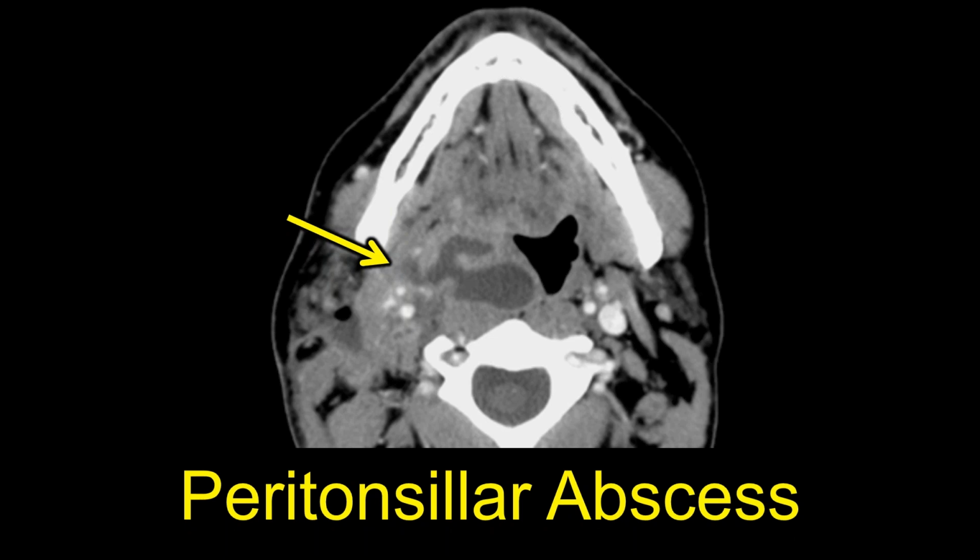or in clinical exam. So this is an axial post-contrasted CT. We see a fluid collection that's centered in that palatine tonsil, and we see surrounding inflammatory infectious changes, and we see the fluid has leaked out of the tonsil into those surrounding spaces. So that's a good appearance for a peritonsillar abscess, or PTA, and that's the most common infection thought of in the head and neck area.